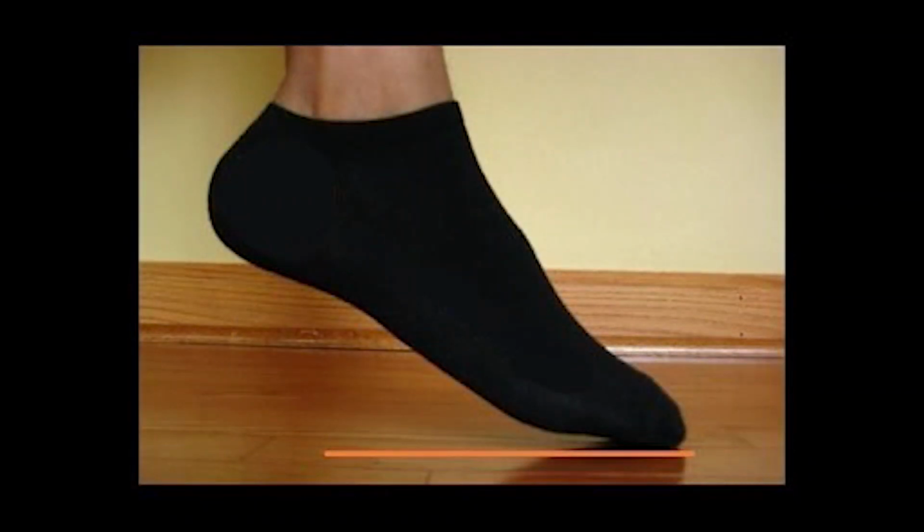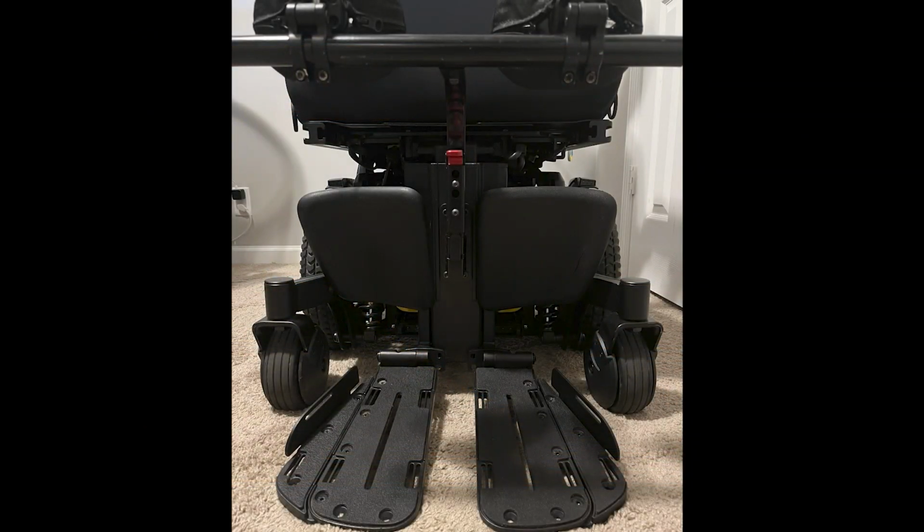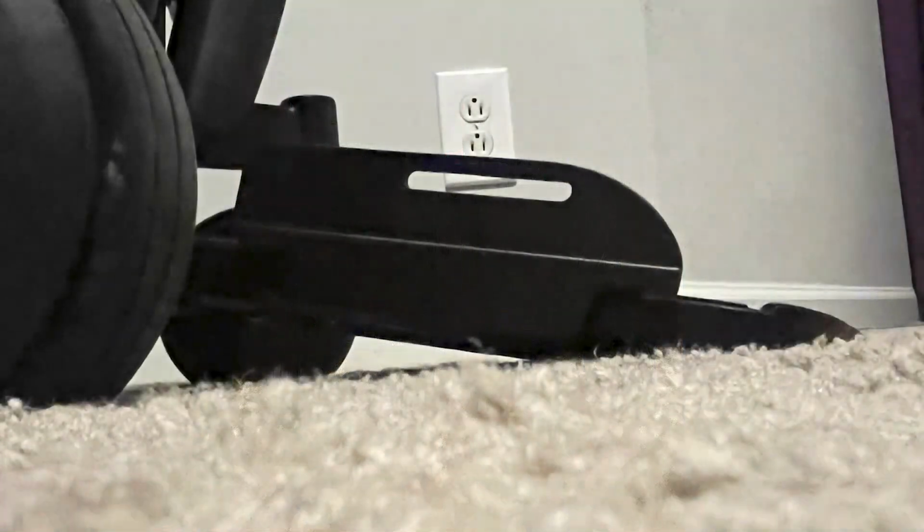In some conditions like ALS, neuropathy may cause what is commonly called a foot drop, a non-reducible permanent state of a foot in plantar flexion. A common seating accommodation for non-reducible plantar flexion is to adjust the angle of the foot plates to provide proper support for the feet. However, as shown here, this could leave the foot plates touching the ground. While there are other ways to help mitigate floor contact, for the sake of this video, we are going to review programming considerations for when the foot plates touch the floor.